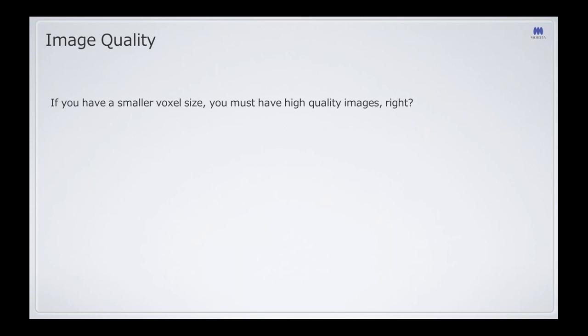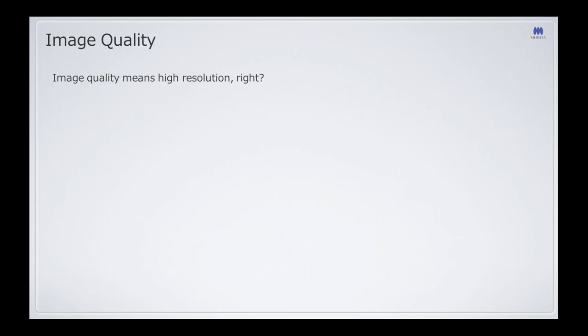When you shrink your voxels down, when you go for a smaller voxel size or a higher image resolution, what you also increase is the noise in that image. You saw that when we were looking at Idixel, when we did a 0.5 millimeter slice versus a 1 millimeter slice. The difference was increased noise.